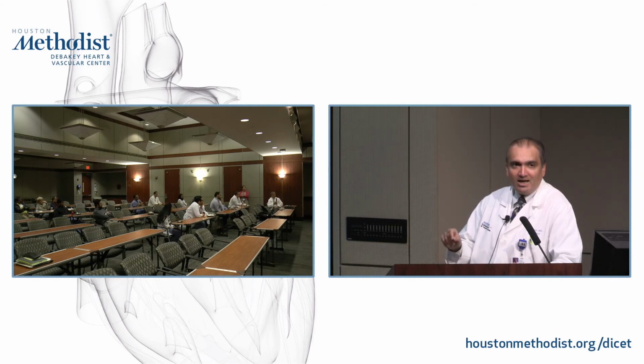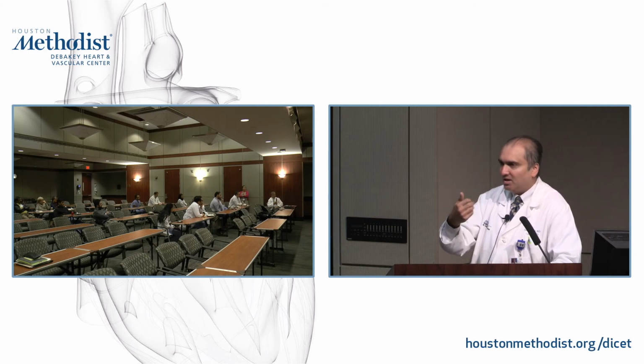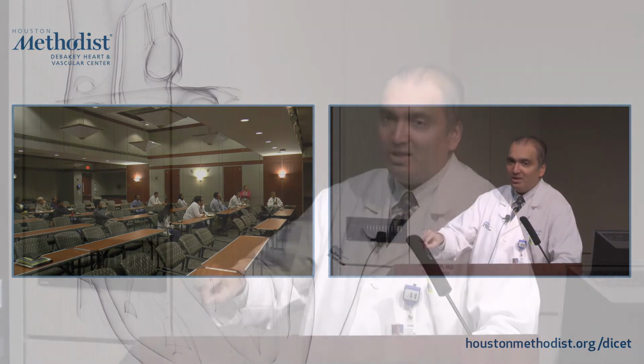So that's why for AI cases, what we'll typically do is do it at the mid-ascending aorta, where we use it for the forward flow assessment, but do an extra one specifically at the aortic root level. And that's the one that we'll use to do our AI quantification.